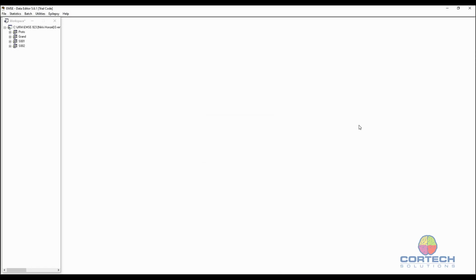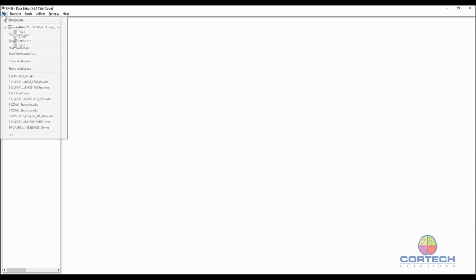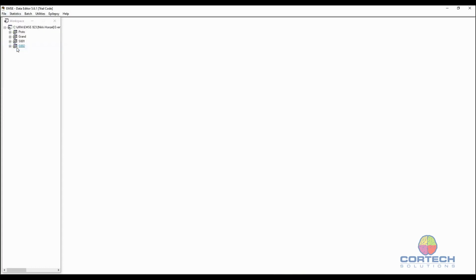Okay, so you'll see the workspace now has two new projects. I don't know how you want to number your participants, but I just sort of arbitrarily called this S001. I think that's you, Nikki, and S002 should be Lloyd's. And you'll notice this little asterisk here, which means that the script added these two projects to the workspace, but that workspace hasn't been saved. So I'm just going to File, Save Workspace. Okay, now it's been saved to the workspace file.